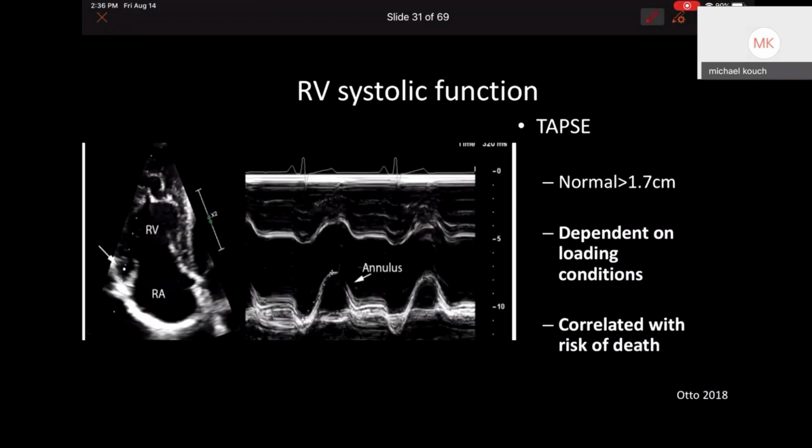Good. All right. And then in RV systolic function, we can actually use how the myocardium moves as a way to estimate someone's systolic function of their right ventricle in particular. So here on the left side of our screen, we have our RV and we have our RA. Our right ventricle moves very differently during systolic function than our left ventricle, right? It's this big floppy chamber that wraps around the left ventricle, and it doesn't compress in a concentric manner. It mostly moves from the base to the apex. So this base is going to move upwards towards the apex and vice versa.